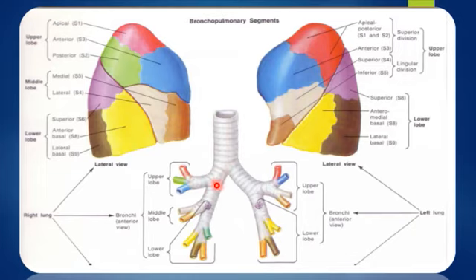Right main bronchus produces an obtuse angle. It is steeper, shorter than the left, measuring about 2.2 centimeters, while the left side is 5 centimeters. And it is easily seen on the CT scan. The bronchi usually produce ring shadow on the chest radiograph.